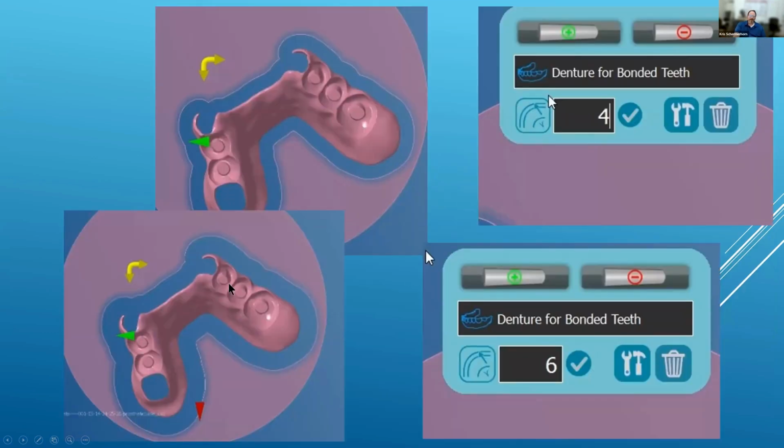Mailbox, not too different. Here's my offset I was talking about. This is the offset for a 3mm tool, which is 4mm of offset. For the 4mm tool, it's 6mm offset. You see, there's not very much room for another partial in there. So, my opinion, stick with the 3mm tool. You could even bump this down to 3.5mm offset.